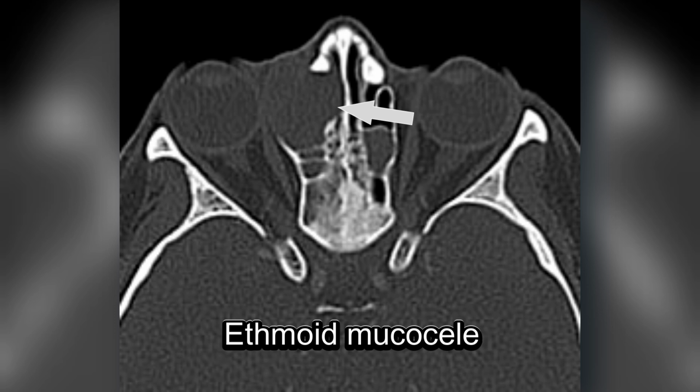Other conditions can also cause opacification of the sinuses. These include tumors of the paranasal sinuses, retention cysts, sinonasal polyps, and chronic sinusitis. However, when you see all three findings, opacification, expansion, and remodeling, a mucocele should be your first consideration.